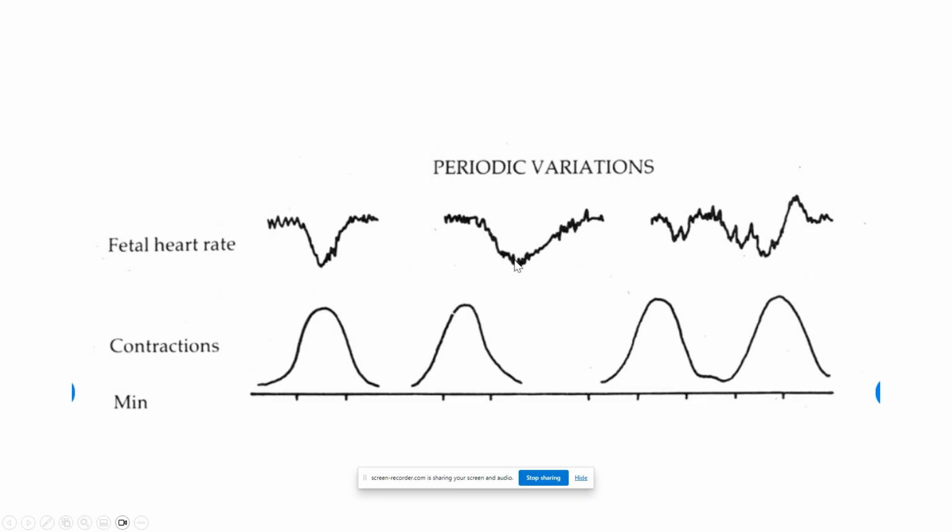So a late deceleration, again, is when the heart rate starts to drop after the peak of the contraction. Remember, each box represents 10 seconds. So this is about a good 1 to 2 minutes where our baby's heart rate is not in the norm. As you can see here, during an early deceleration, as soon as the contraction's over, the baby is at the normal heart rate. But with a late deceleration, it starts to drop at the peak of the contraction, and the heart rate is down, down, down, and it's slowly coming back up, which takes a lot of time and it's very bad for our baby. Our baby's not getting oxygenation during that time.